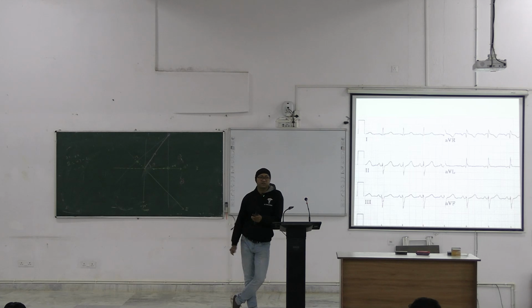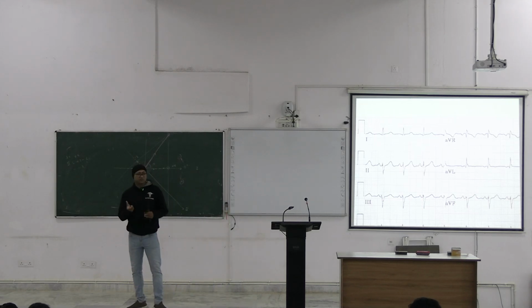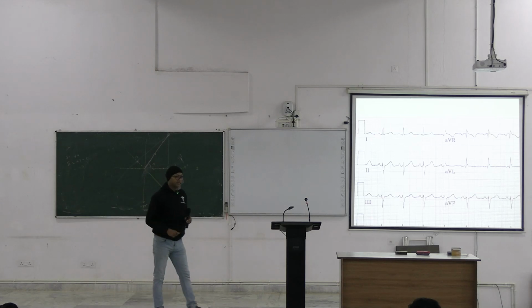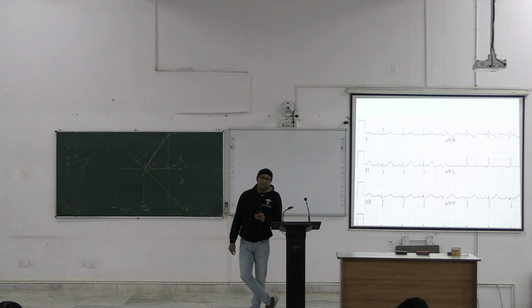But this is the accurate method. You need to perform this in your practical examination, and if a theory question comes on this, you need to draw it. Don't forget to take your pencil, scale and protractor during the practical examination, because this question frequently comes. Axis determination from an ECG is a basic skill, along with heart rate determination.